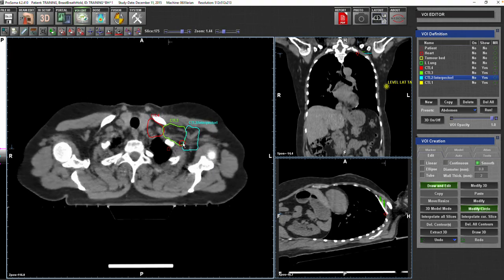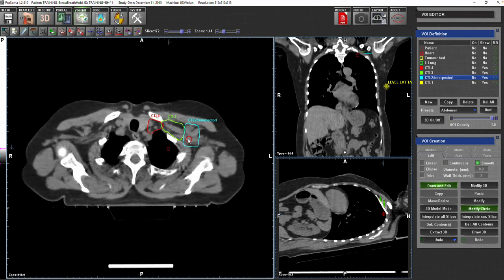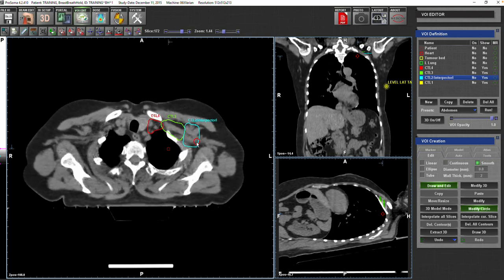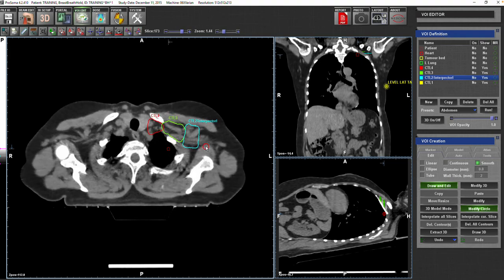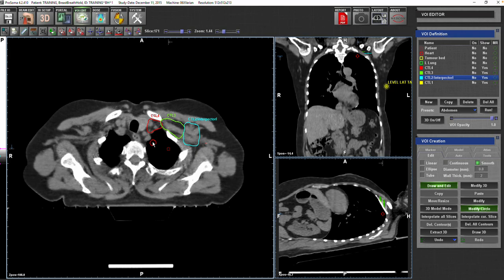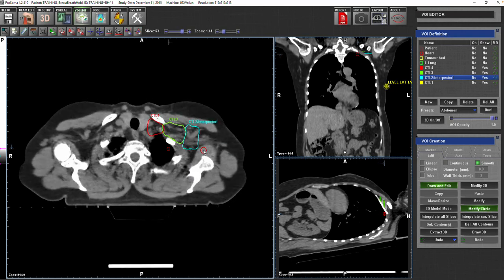For example, if you see the vessels going medial, crossing the lateral edge of the muscle, by the way, don't forget that the artery is going from medial to lateral to the axilla, but the vein is going from the arm to the innominate. I know that all of you know that, but just to remind ourselves.